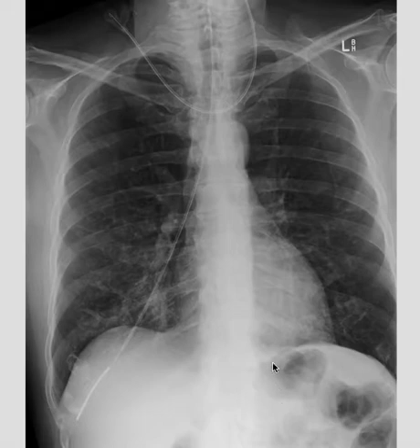orally. So normally the tube, as I mentioned, would be coming down the esophagus up to sort of this point, where it would then pass through the esophageal sphincter and junction into the stomach, which would be sort of positioned here below the diaphragm. So actually it would come down quite low, probably to this point. However, in this image, obviously we can see that the nasogastric tube, as it descends, actually enters a region that is not below the diaphragm.